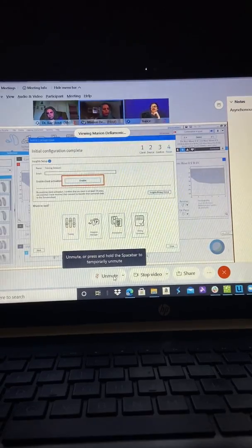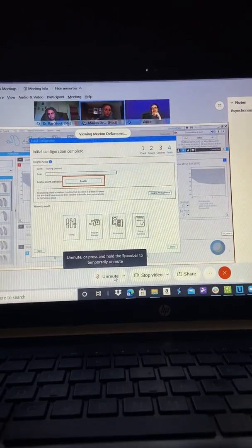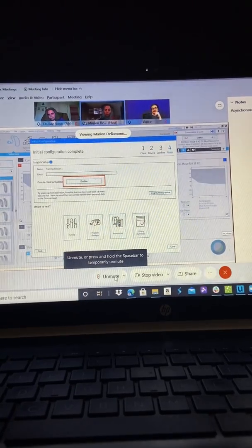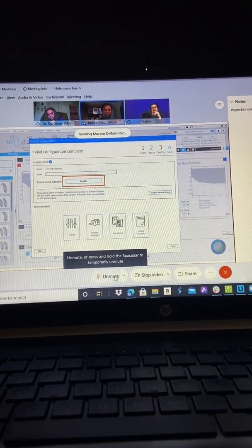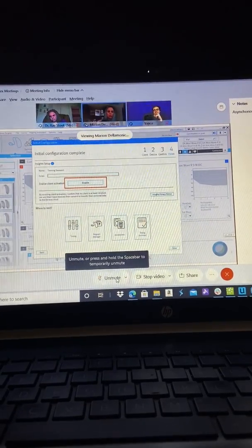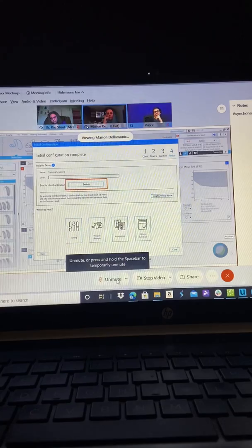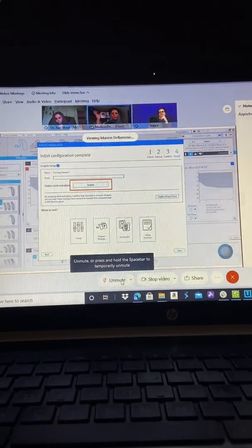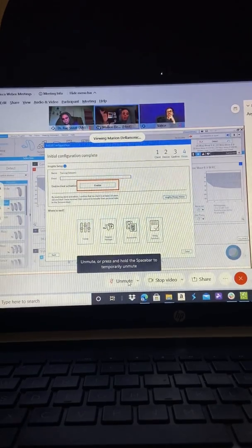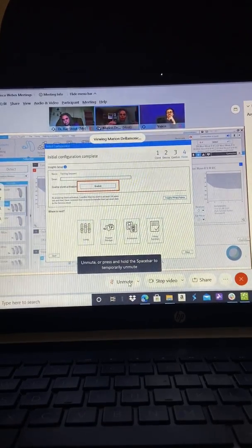You just leave it logged in all the time, so no worries there. It's super quick. Then for each patient with Discover Next wireless instruments, we do need you to opt in on the provider side, which is in TrueFit. And then you're also going to have the patient opt in on the phone side. And I'll tell you why. It's because we do use some PHI, and I never can remember what the acronym stands for, if it's protected or personal patient health information.